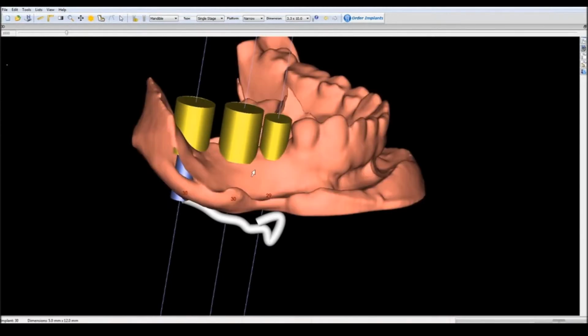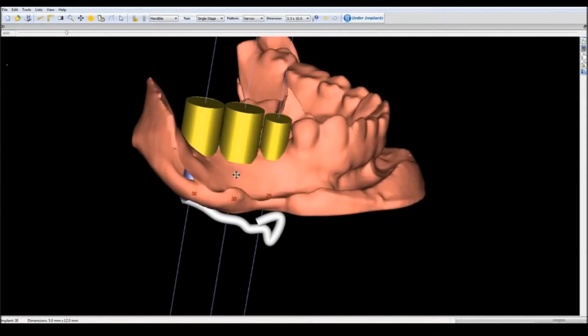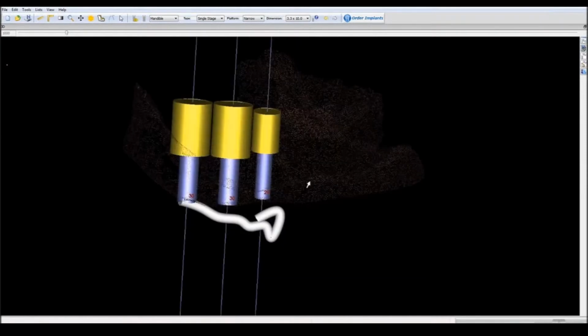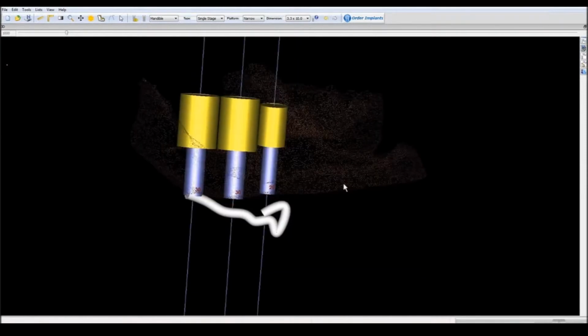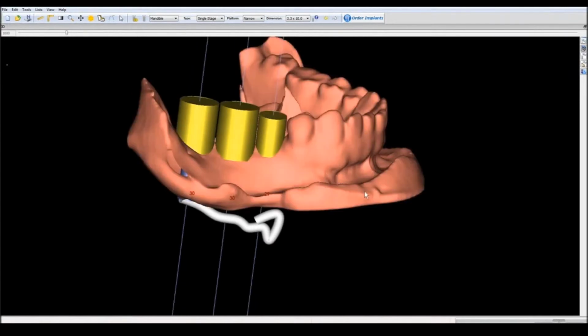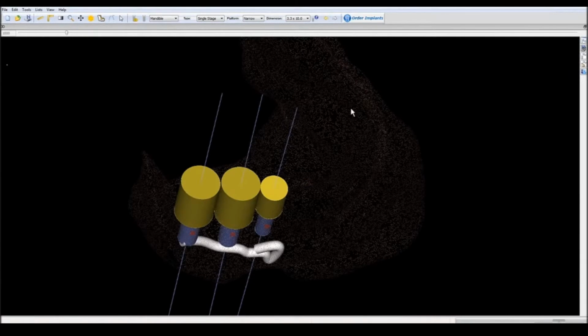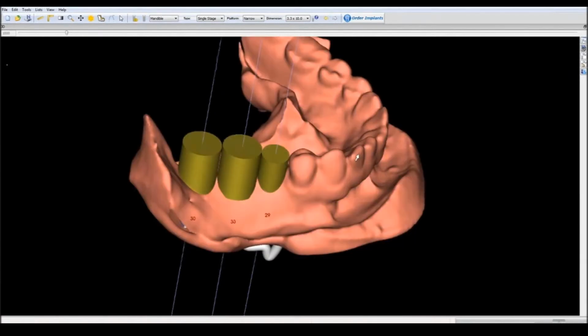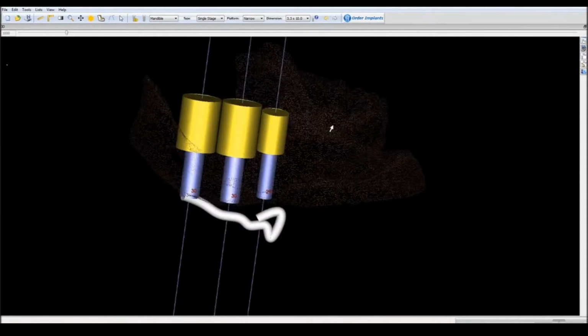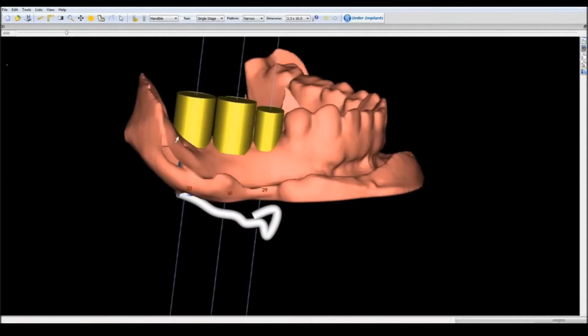So I can bring this first molar here, second molar here, and I can have an ideal relationship between these implants. Again, what we're trying to do is create virtually the same process that one would do on an articulator. Except I think when we do it virtually, you have more views and can do it better. Okay, so now we have mesial distal.